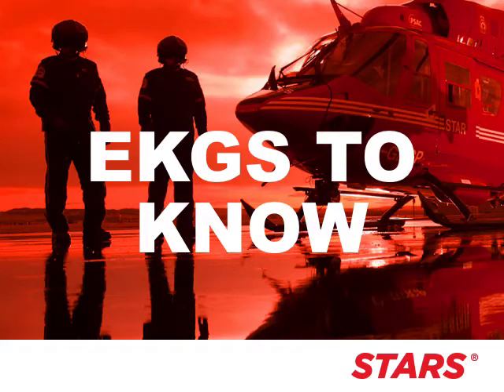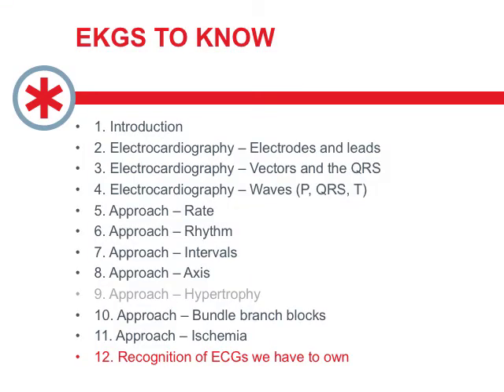Well, welcome everyone. You are finally at the end, and we have reached the final step in recognizing ECGs that we just need to know. We've now gone through our really stepwise approach, particularly looking at rate, rhythm, axis, intervals, bundle branch blocks, and signs of ischemia. And now we're just going to look at the ECG and ask ourselves, are there any of those ECGs that we just have to recognize some patterns in and the like?